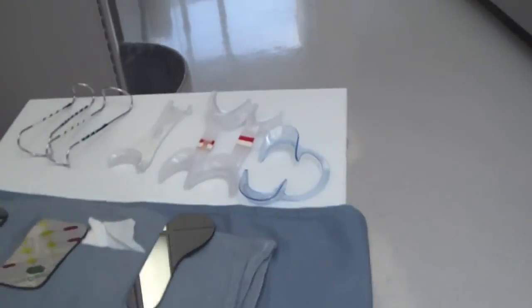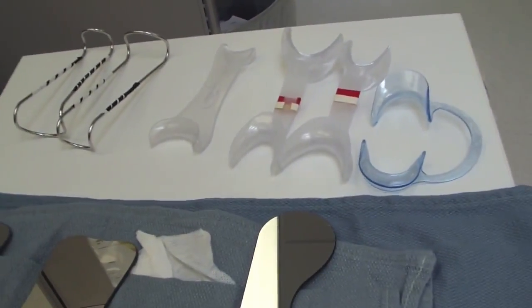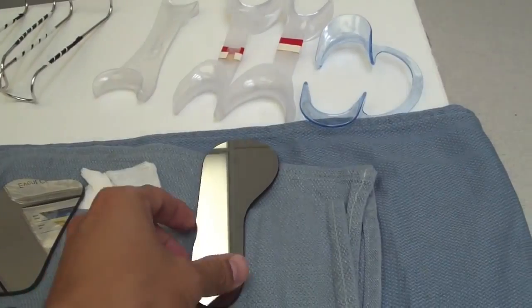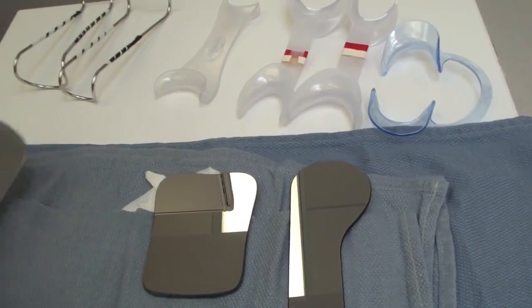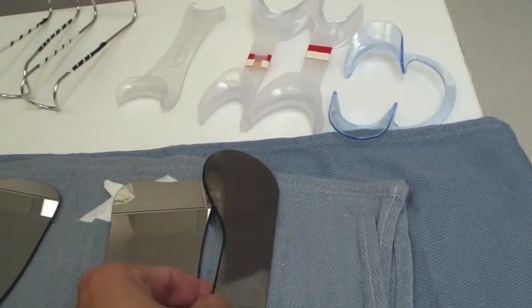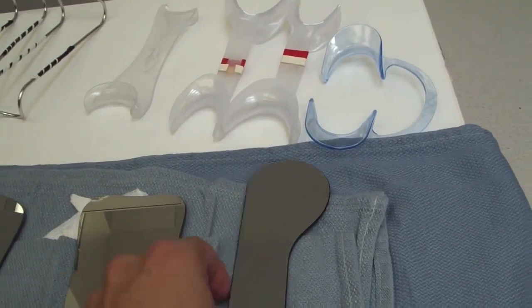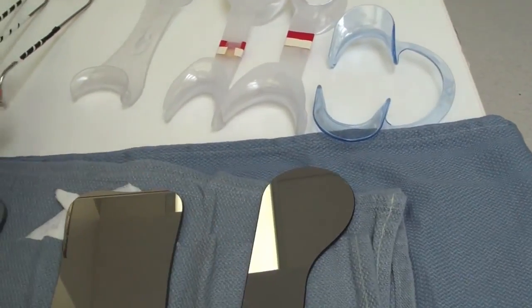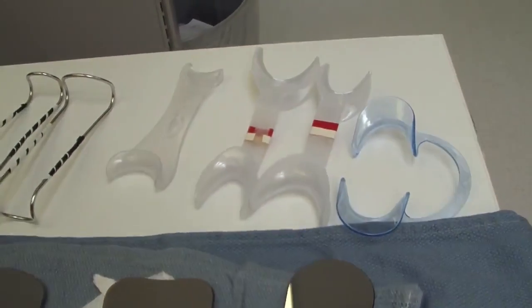So some of the mirrors and retractors that we have available, there's a wide range, but some of the basic ones that we have are just different shapes for different procedures. This would be like an occlusal. This would be, say, a buccal shot. This is also for a buccal shot. There's different types. I have a titanium oxide coated one. These are chromium. They all have their different little prices and costs and touted benefits.